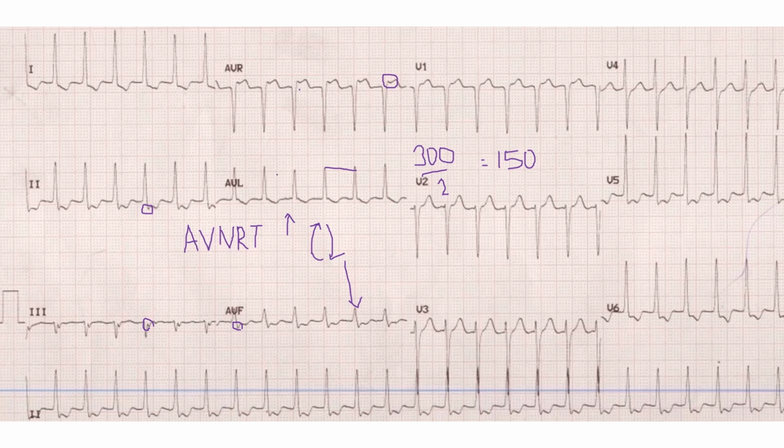So this is most likely an AVNRT, but the differential diagnosis is AVRT, atrioventricular reentrant tachycardia in WPW syndrome.